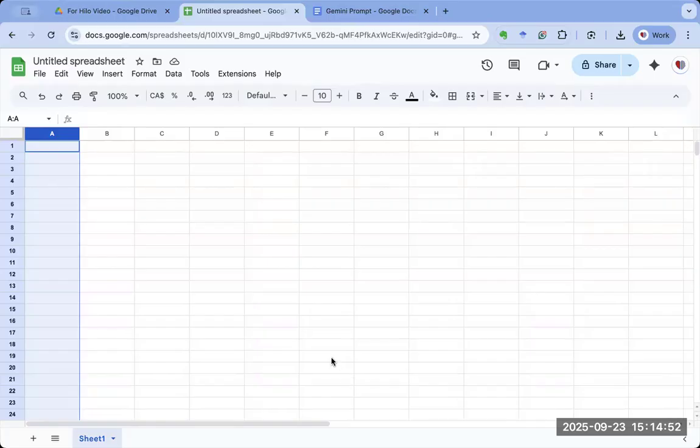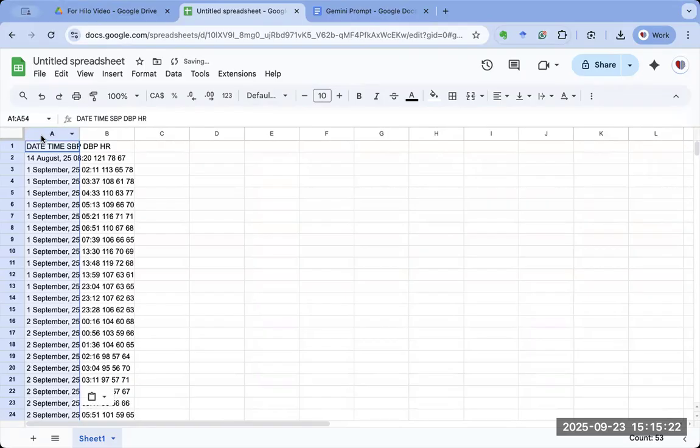Now my Google Workspace account, I have signed something called the BAA. So it is supposed to be HIPAA compliant, but I want to be very careful about data privacy. So whether you should use your own Gemini account, Google account, or ChatGPT, that is your decision. I don't want to be involved in that because of privacy concerns. So what I did is from that PDF, I have copied it and I'm going to paste it here.